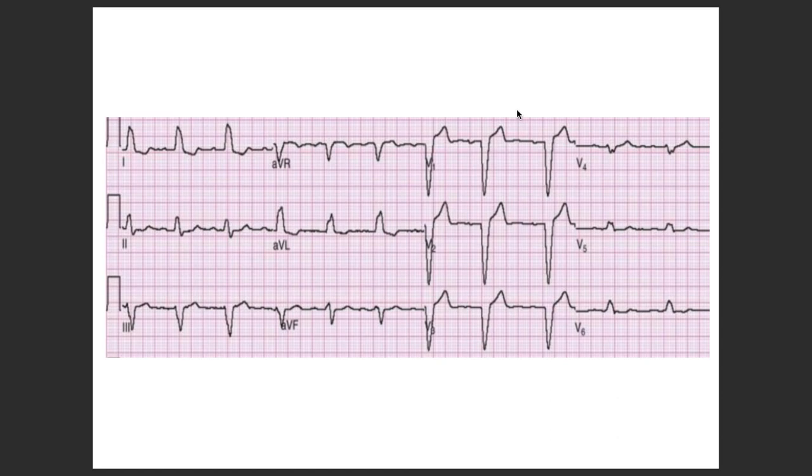Are we able to see the P waves in this? So what are the leads? Now, okay, I'm again having to divert from my topic. So what are the leads you try to see if you want to see the P waves? Lead 2. Good. And there are various of them. Lead 2 is one of the best. Now, V1 and lead 2 are in fact the best.